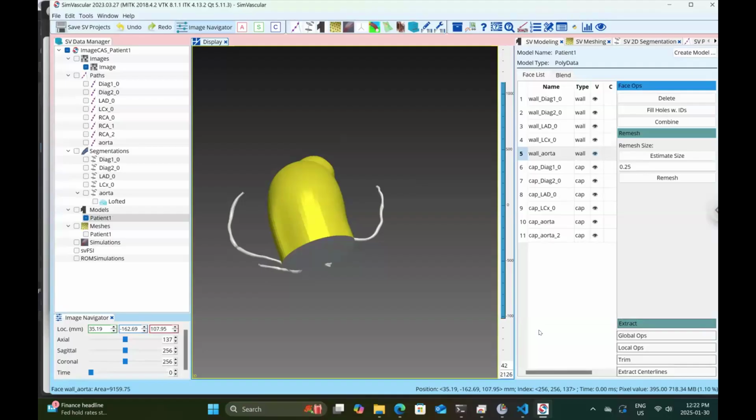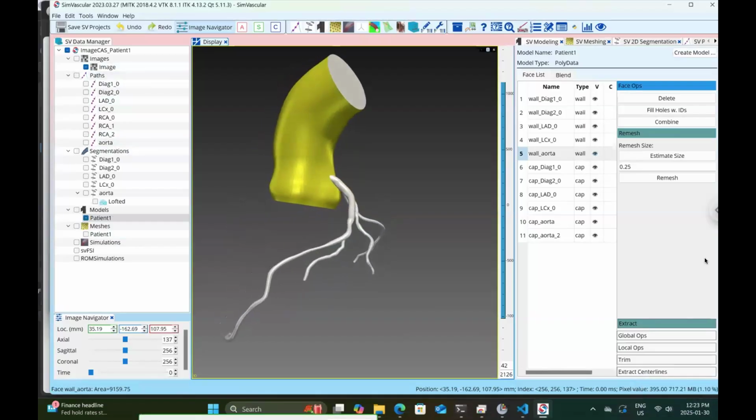Okay. So Ravneet, are you saying you want us to show the right coronary artery, or you're okay to move on? Sorry, I don't know if it'll take too long, but if you could just show it a little bit. Yeah, that's not a problem. Okay, thank you. So let's start with the right coronary artery.